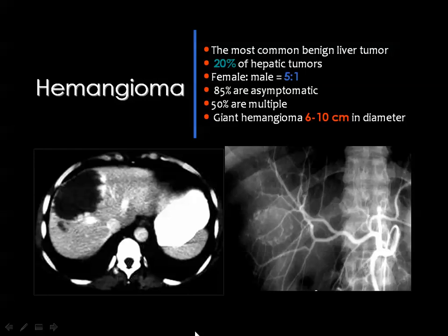And in order to separate hemangioma from the abscess, hemangioma will show marginal enhancement, but the enhancement will be nodular. And this is the classic appearance of hemangioma at angiography, and you see the enhancing nodules along the margin of the hemangioma. And this is the CT scan showing the cystic appearance of the hemangioma and the nodular marginal enhancement of the lesion. One of the supportive criteria for the diagnosis of hemangioma is that whenever it touches the hepatic contour, it does not disturb the hepatic contour.